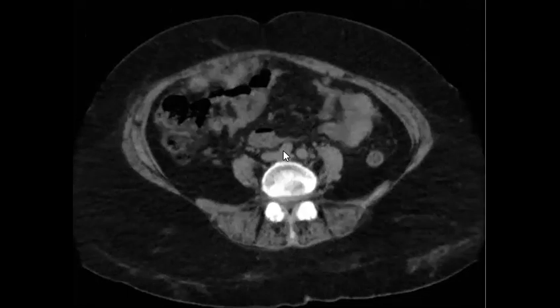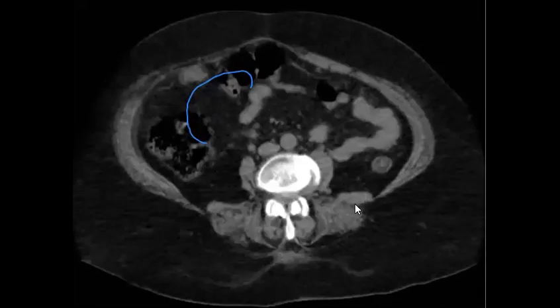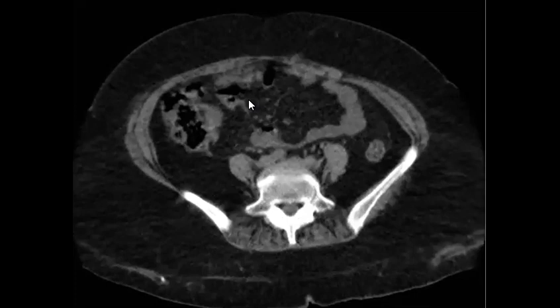I will stop and try to, anyone can draw it. If you have the axis, Rabab, perfect Rabab. So what are you going to do? Perfect, nice. Who drew this? Very nice. I agree with you. So you can see clearly that there is peritoneal infiltration.